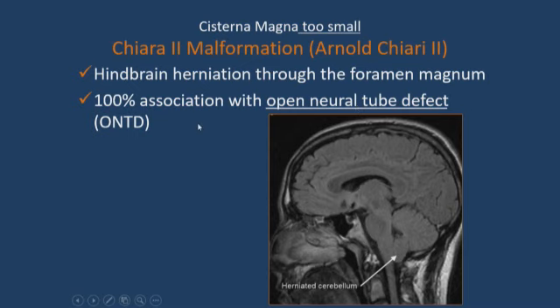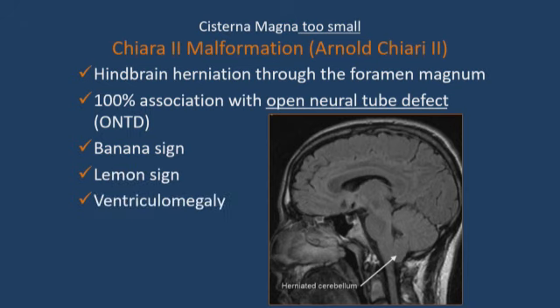And this is important, not so much for the bigger meningomyelocele, it's the smaller ones and the flat defects where there's no sac or anything over there, the ones that we normally would miss. That's why I really pay close attention to that posterior fossa. So we talked about those, and then ventriculomegaly, because if things are being obstructed, then you can get dilated ventricles also.